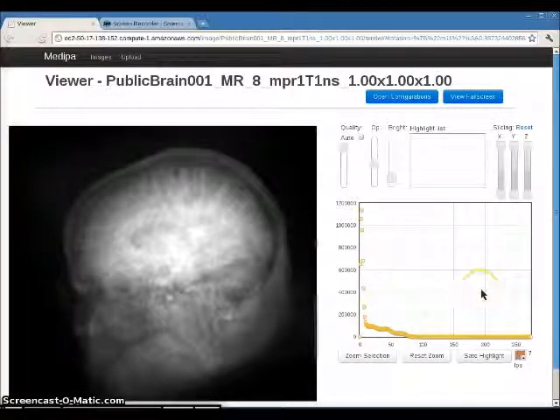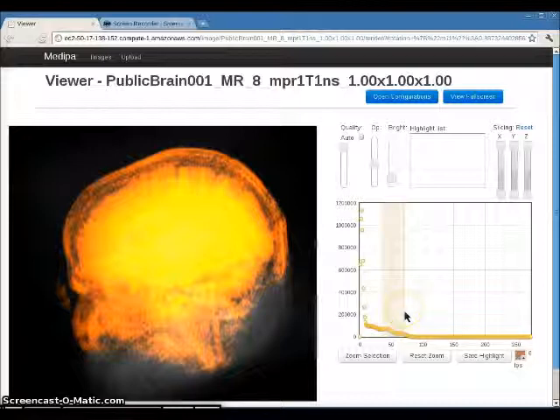This is to help the user identify different aspects of the image that they can hopefully highlight. Depending on the image or the thing being represented, this can have a drastic effect on the usefulness of the histogram. But for example, if you just highlight on the list, you'll see it instantly light up.